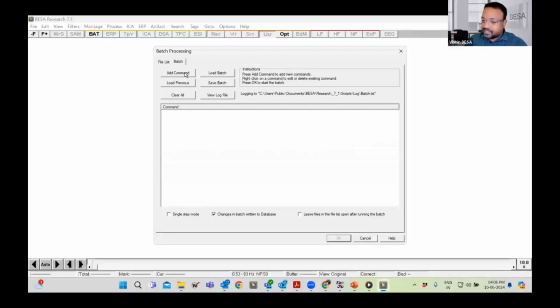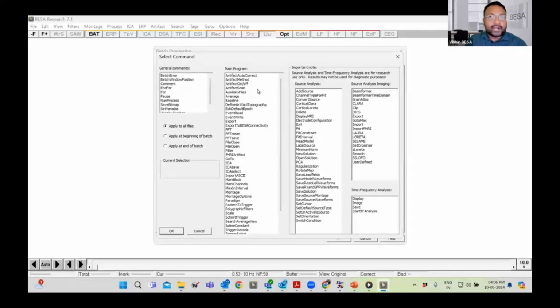In this case, the first process is to load the paradigm which was already created by Harald, as you saw sometime back, explaining that the 60 dB trigger is indeed 60 dB. So we can just add command. First, we need to add the paradigm files which are available, or else which need to be made once.